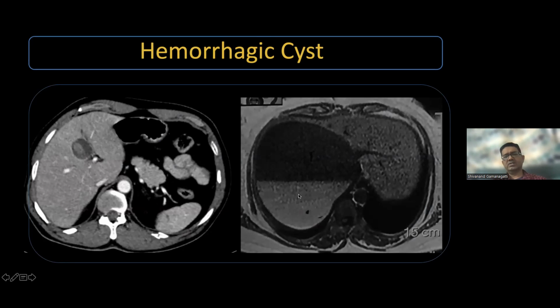Again, this does not need any intervention or anything further. You can just keep these patients under follow-up. What is happening to the size?